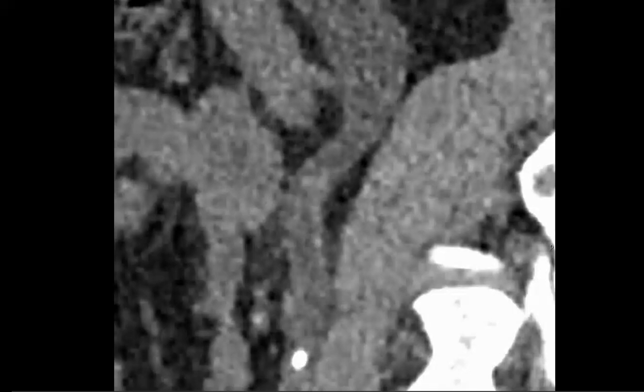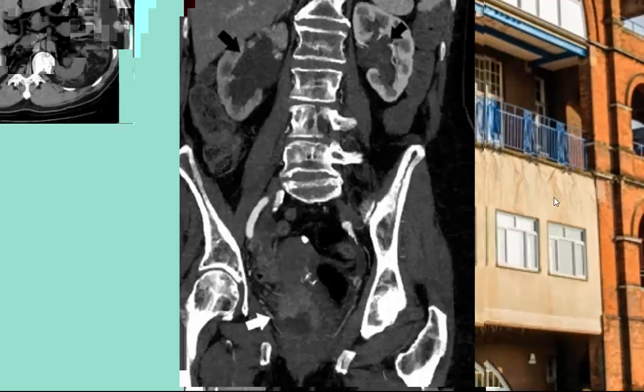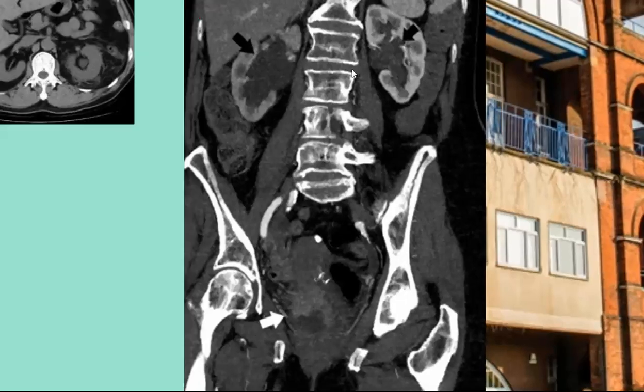Other causes of obstruction may be further downstream. Here is a CT showing bilateral hydronephrosis as depicted by the black arrows with the dilatation of the calyces. And down here in the bladder is this enhancing mass consistent with a transitional cell carcinoma, basically taking out both ureteric orifices, causing hydronephrosis.